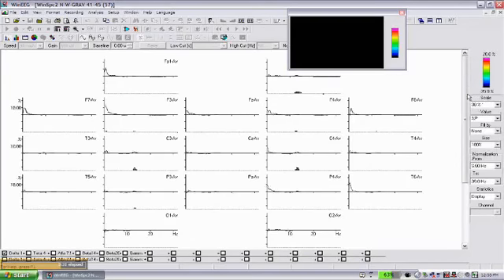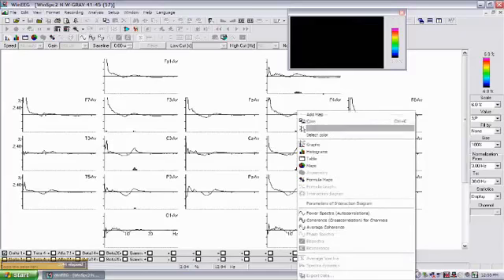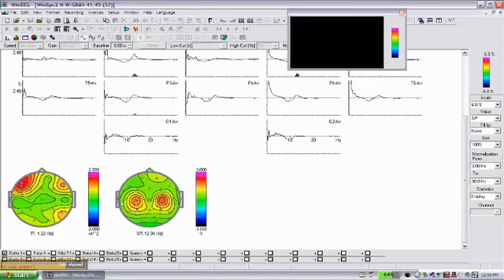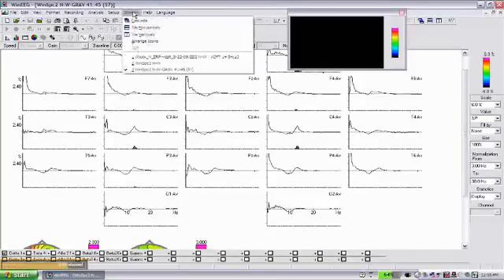In this normalization band you can see that this patient has excessive activity at frequency band about 13 Hertz. So it's probably mu rhythm, which is generated over the sensory motor strip, and of quite high frequency band. Okay, so that's what we got from this analysis.